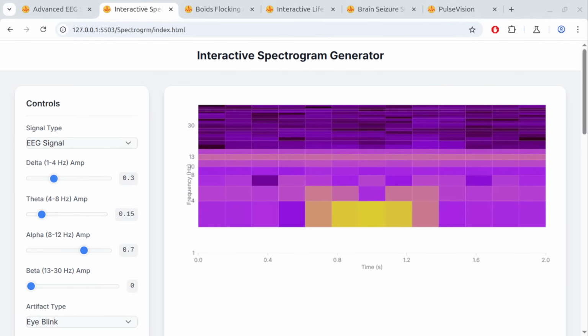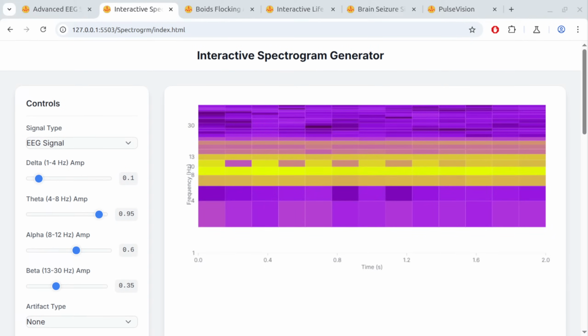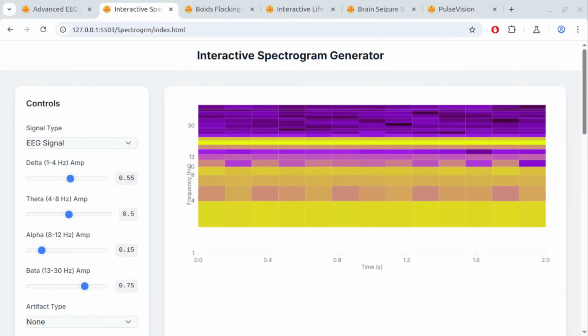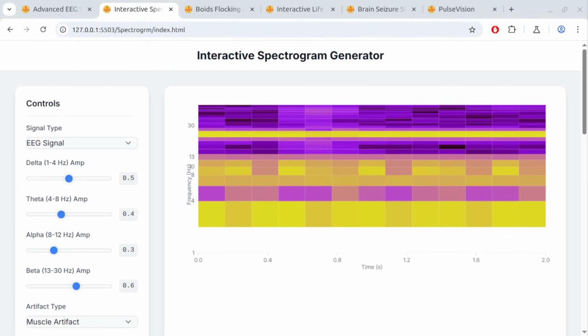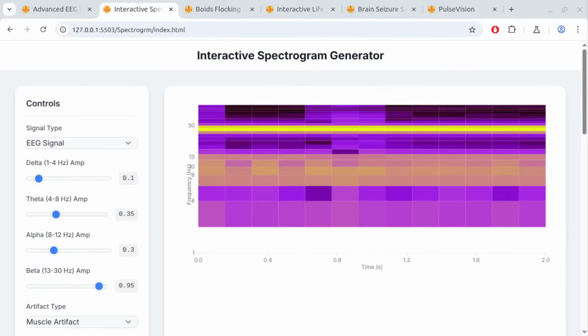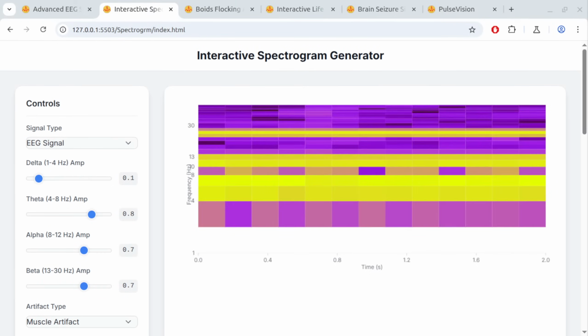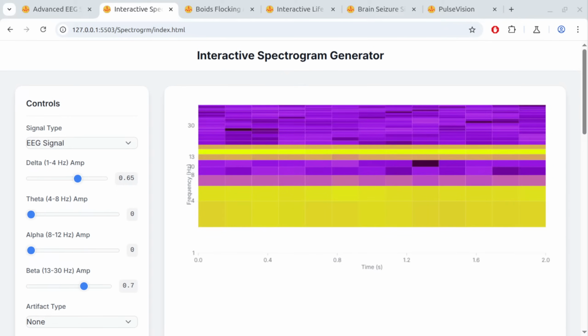And what's the developer's response at the moment? The developer acknowledges the feedback regarding the logarithmic scaling and layout spacing. They plan to correct the logarithmic scaling logic, increase the frequency resolution, adjust the padding and margins for a more compact layout, and enhance the grid lines to improve the spectrogram display. They are also updating the code in Canvas based on these changes.